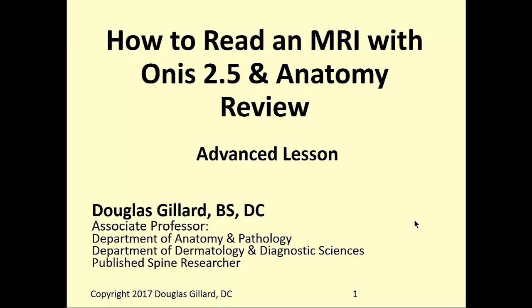This is going to be a video on how to read an MRI disc with a program called Onis 2.5. Now this is a Windows PC program. It doesn't work with Mac. You'd have to get something called Osirix, so you're out of luck if you're a Mac person. I'm also going to do a little anatomy review because you're probably a little rusty on that.